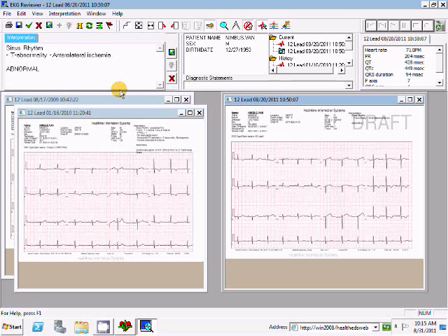Most physicians like to start with the ECG automatic interpretation, and we have it configured to automatically fill that in, as it is now. To the right is a window that shows general patient information. As always, we can add to or change items to show whatever is meaningful to your physicians. Next is a folder view of the patient's current and historical ECGs. This gives you a quick shortcut to prior ECGs.